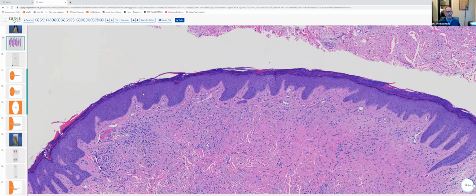And if we take a look in the deeper dermis, we can see that the cells tend to break up into cords, strands and solitary units in the lower portions of the dermis. There are no nests here, and the cells themselves are quite a bit smaller. The nuclei are smaller, with less abundant cytoplasm. And again, the mitotic figures were not readily apparent in these sections, nor is there much of a host response.